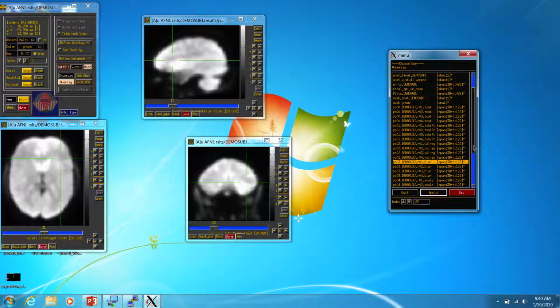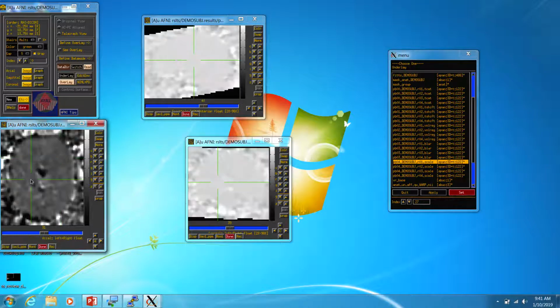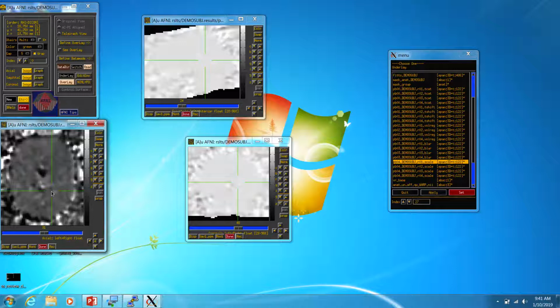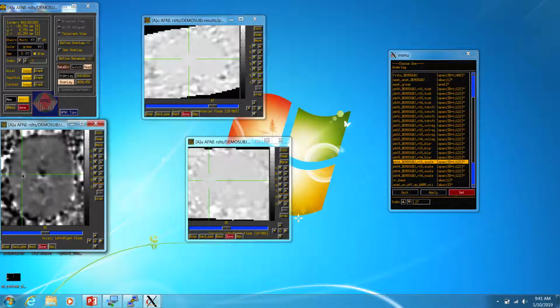And then the last step, we won't see too much visual change here. Maybe a slight change in the colors. So this is basically a rescaling of the EPI data. So this looks noisier in some ways, but actually what we end up having here is basically everything, including what's in the brain and what's outside the brain, is in the same space across runs.